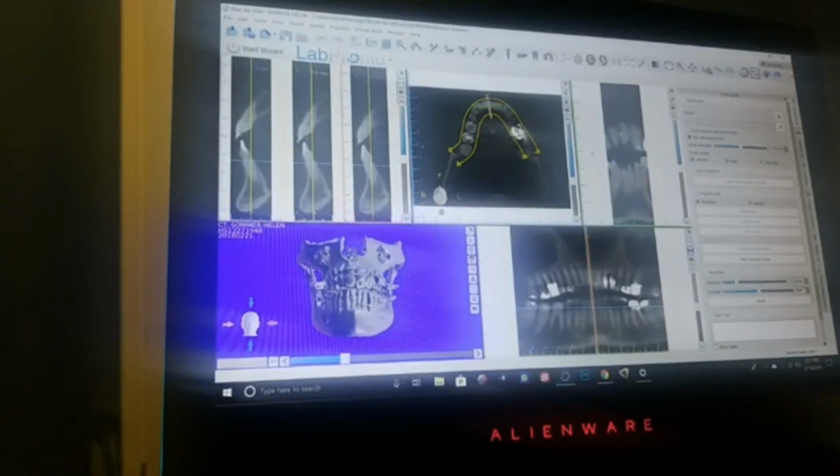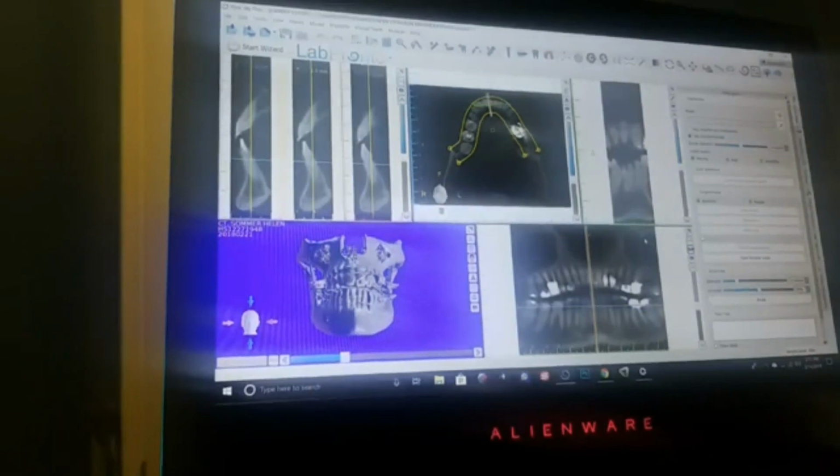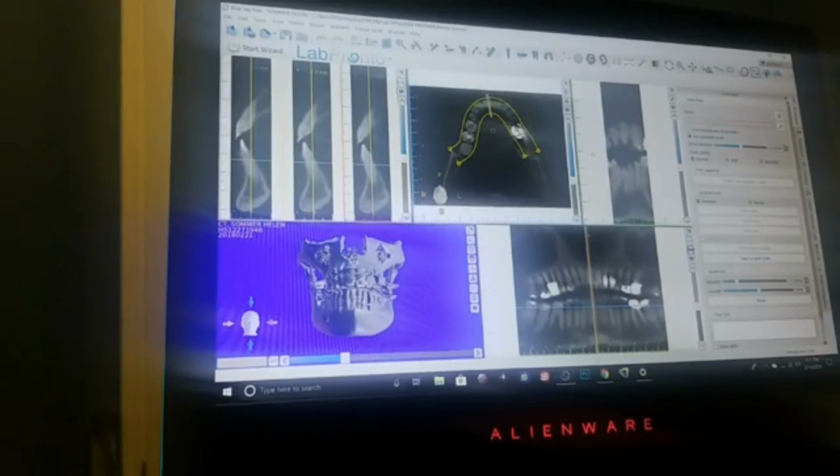Okay, we're going to skip this image over here for one second, because it's a little bit more complicated, and we're going to talk about that. And then we're going to come down here, so everybody is familiar with a panoramic view. Obviously, a panoramic view is the image that goes from the left to the right or right to the left, whichever direction you want to consider it. But that's basically your panoramic view.